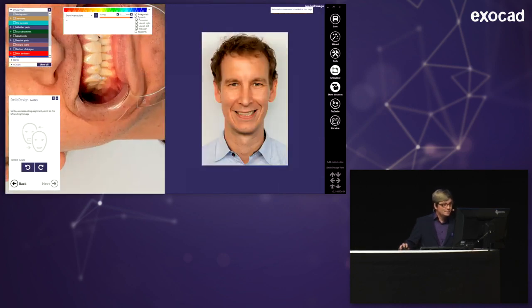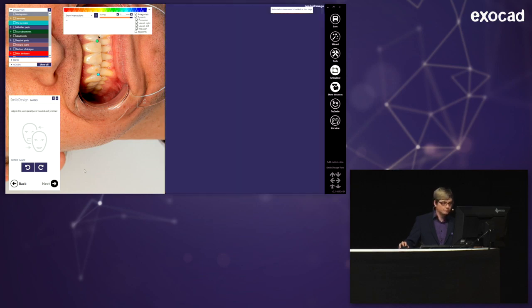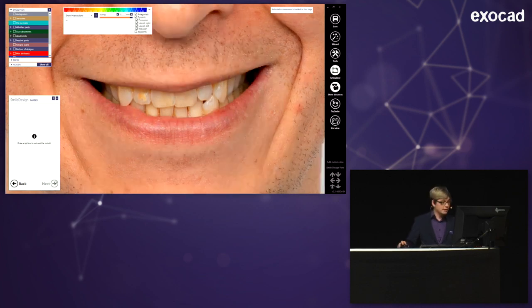Yeah, as you've seen, I clicked on the picture on the wrong point and then didn't delete the point, but just kept clicking, and that was the mistake. But in this way, it might now work. So you see all those steps again. Maybe now you understand what I'm doing a little bit better.